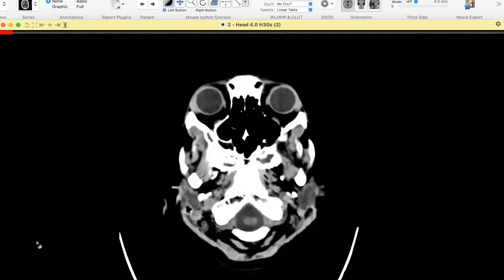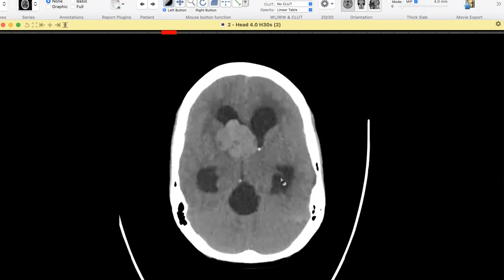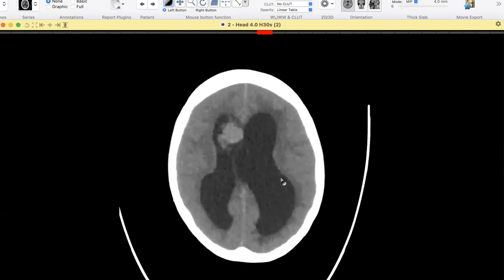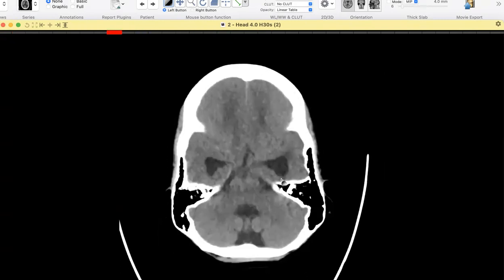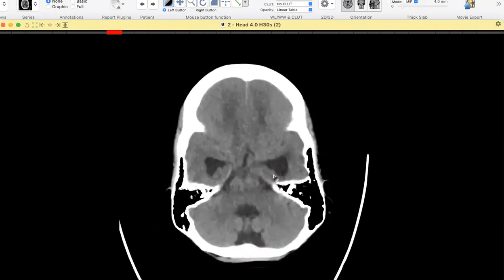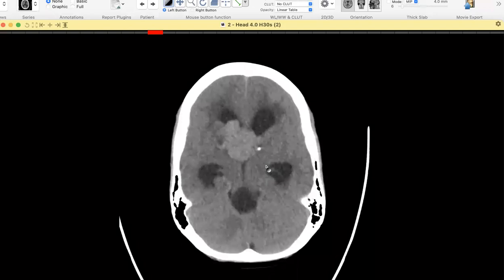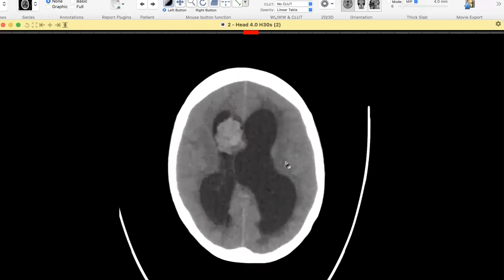Okay, so a CT was also done for this patient. Can you just take a look and see if it adds anything? So on this non-enhanced CT scan, the lesion is hyperdense. There are some areas of breaking down, which were obvious in the CT, and there is peripheral calcification, peripheral calcific focus here. So I'm thinking more along the line of the choroid plexus lesion. Okay.